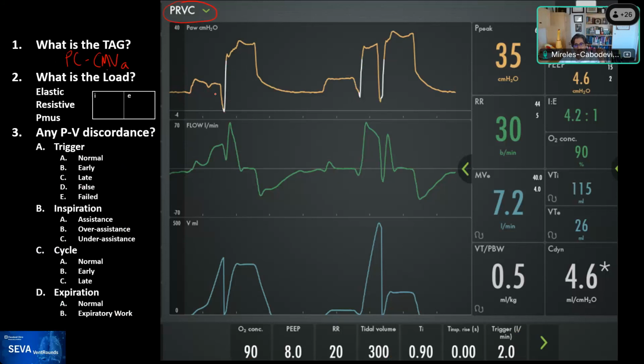And that tells us that this patient is on a pressure trigger, although if I come down here, it says liters per minute, so that doesn't make any sense. Sometimes there's this nonsense, but usually the change in color means that it's being triggered by changes in pressure. And so it's patient triggered, but cycled by time. And that means that every breath is mandatory.